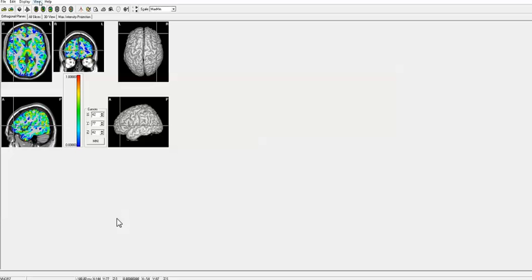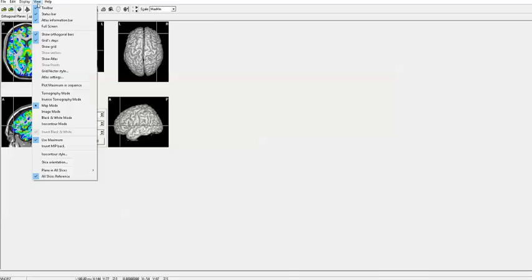And there's also rendered heads. We have these rendered surfaces already in the evoked potential. We now are going to calculate inverse solutions and show the projections of the sources of evoked potentials onto the cortical surface. Going to quickly just go through some of the features that you'll see in the future. These are now OpenGL that will be written and imported into NeuroGuide.